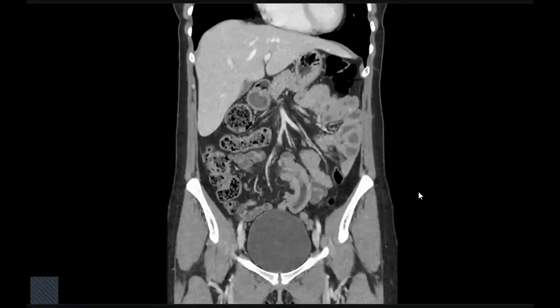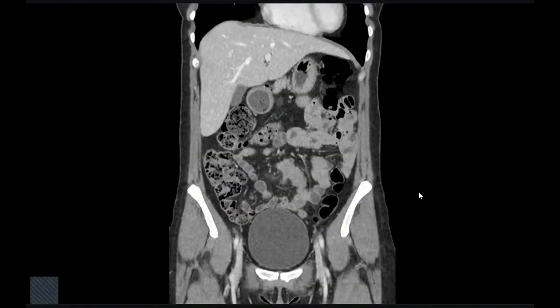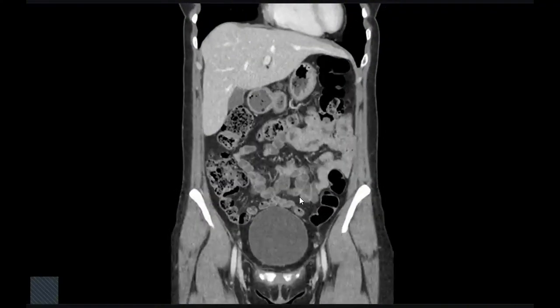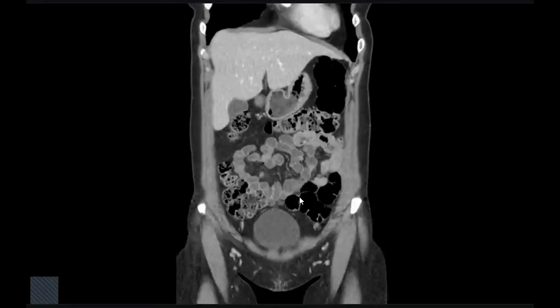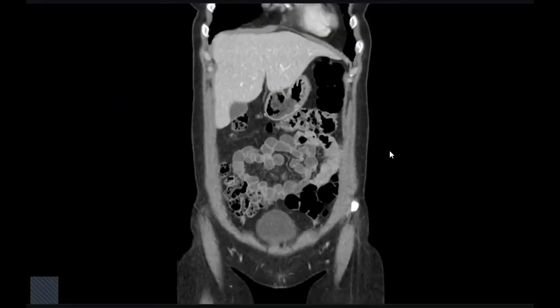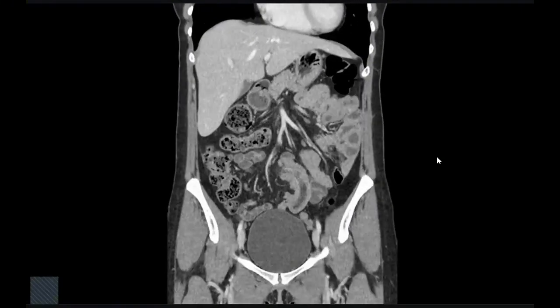The pathology, as we said in the axial. It is not stopping where I want to stop. Leave the mouse. Okay, this is where I found the pathology.